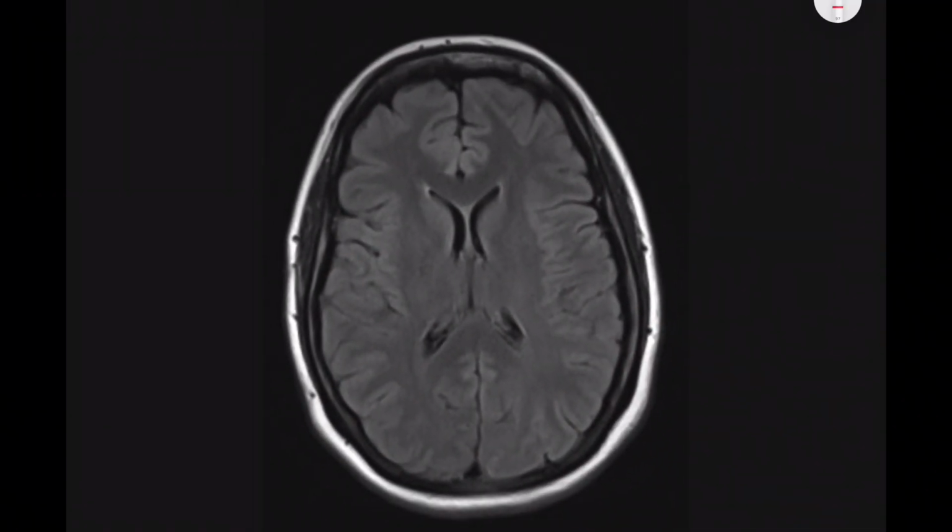Can you find out which type of MRI is this? First of all, look at CSF. This is black, so it can be T1 or Flair. Okay, now look at the gray matter and white matter. Look at this part. The outside part is hyperintense, so this is white. Inside part is hypointense, so this is gray. This is opposite to the normal anatomy, so this is Flair. Now you can differentiate all these three.